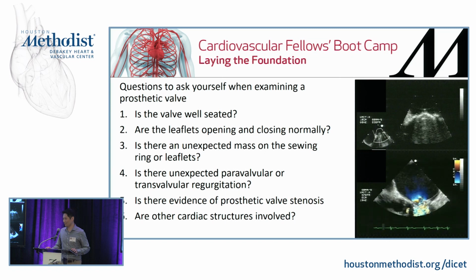Is this valve well seated? Yes, this valve is not moving around, it's staying in place, so that's good. Are the leaflets opening and closing normally? If this picture was going on a loop, you could tell that it's going back and forth and it's okay. Unfortunately, these slides aren't working so great, so I apologize for that.